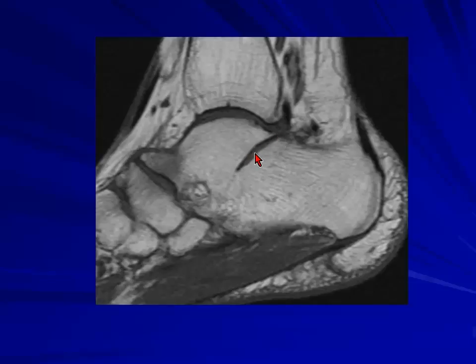So this could be a fibrous fusion, and this may be mobile, or this could be biomechanical, because this is fixed and there's movement still present there. And there, if you do a bone scan, you will see activity there. So maybe this is because of incomplete fusion, if this is basically surgically done. If it is not congenital, then it could be partial or incomplete tarsal coalition.